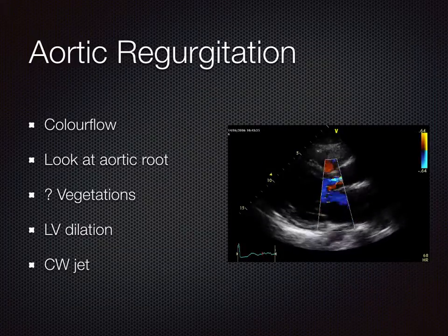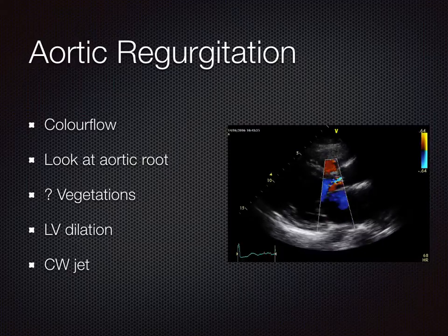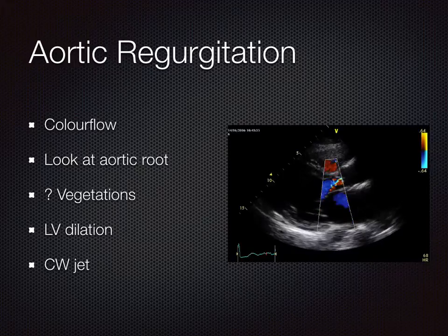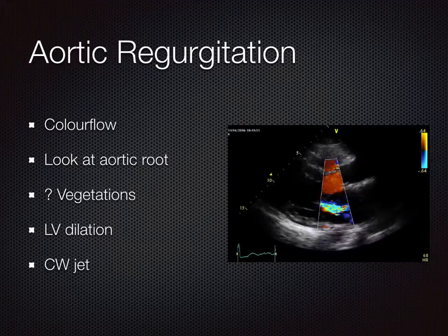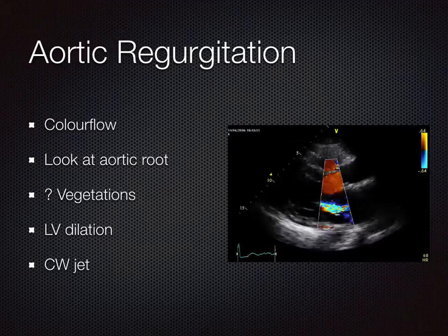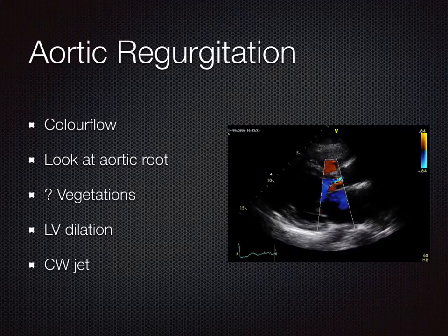Okay, so just a few more images really to look at aortic regurgitation. Sometimes it might be due to vegetations or other things that make the aortic valve not seal properly during diastole.